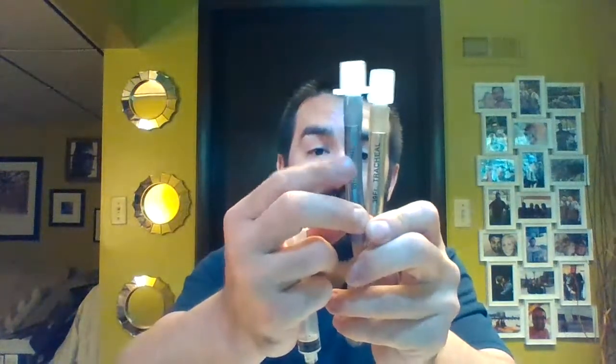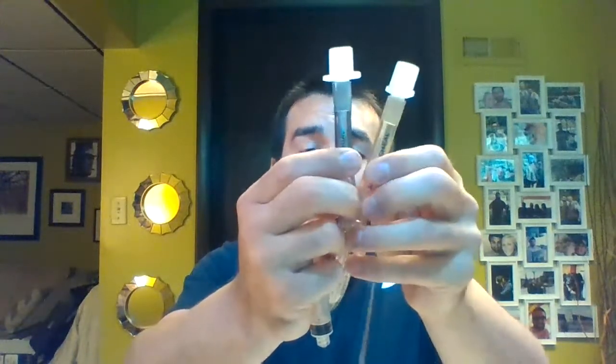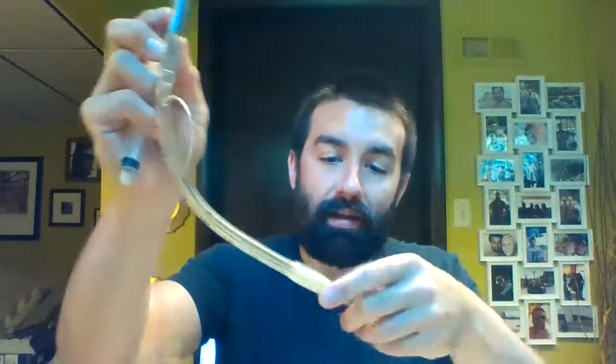This requires 2 ventilators here, 2 suction catheters, and it tells you bronchial. So typically, like a main stem, and then which one is actually directing air out of that side port of your trachea. So endobronchial tubes, we'll talk more about that in our ventilation class. Okay, that's about it with the ET tubes.